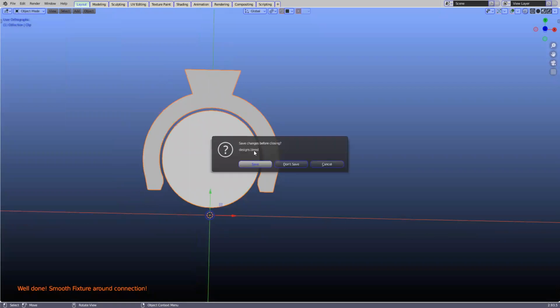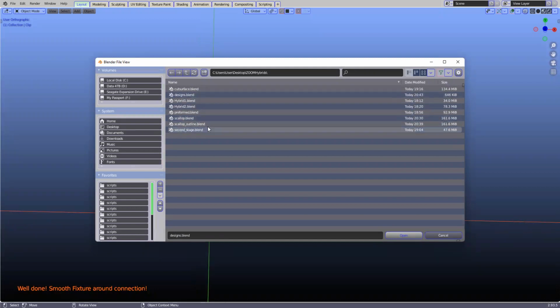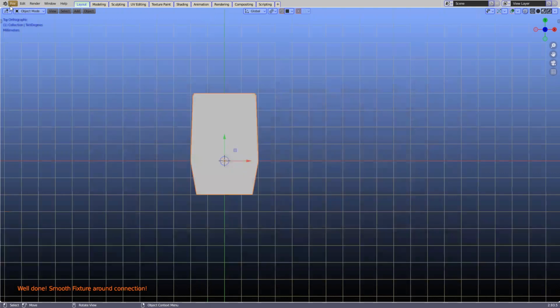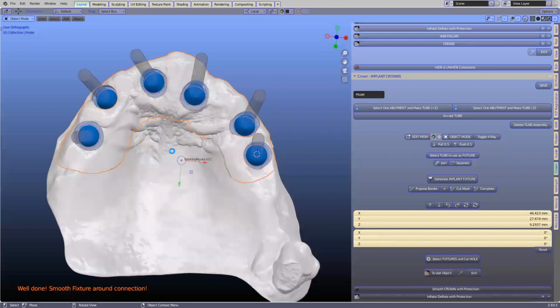So let us open an example. Okay, here, scallop. Is it this one here? No. Just bear with me. Yeah, I can use this file here.